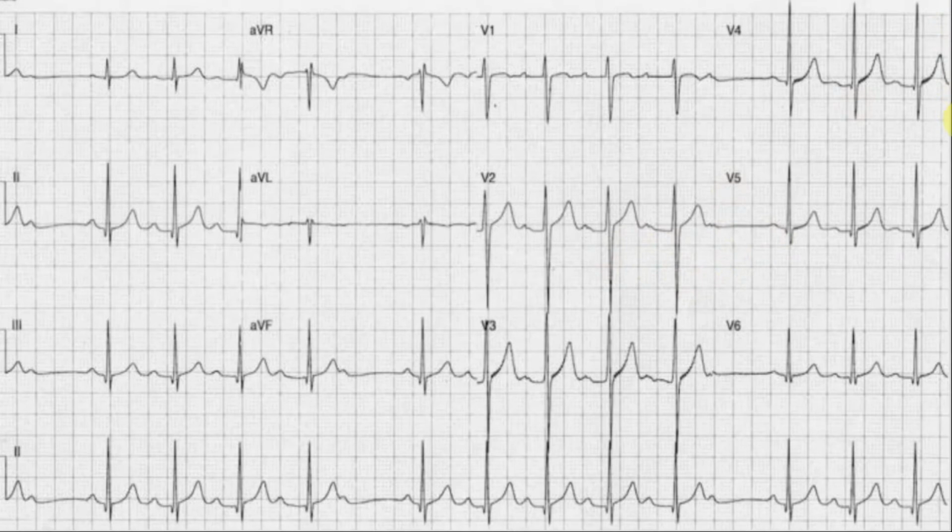Thank you very much. This is another exciting ECG, Avijith. Thank you. As always, I am going to interpret this ECG in a very systematic way. The elephant in the room in this ECG is non-conducted P waves suggestive of a second-degree heart block. I will come back to it in a second. Let me talk you through the usual stuff at first.